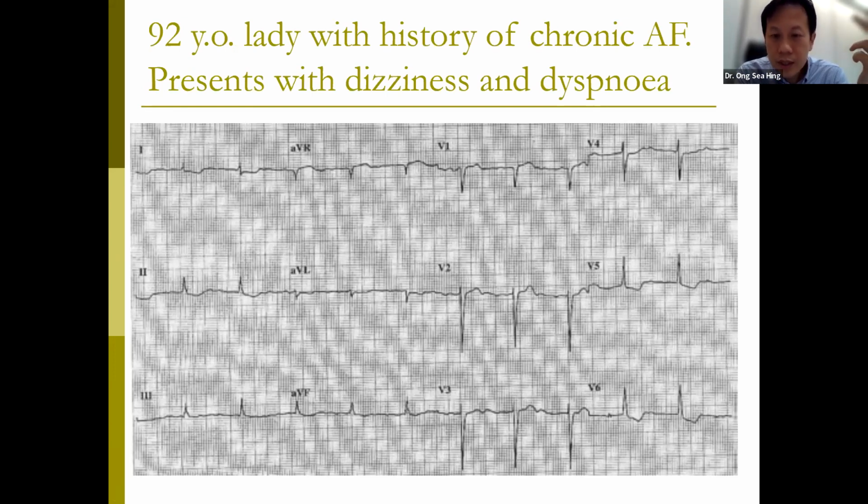Then the second question is, is there a P wave? If you look at these leads, you can't really see a convincing P wave. Is this a P wave with a very prolonged PR interval? That means a P wave with a very severe first degree AV block. Is it a P wave, or is this part of the ST segment, or a U wave at the end?